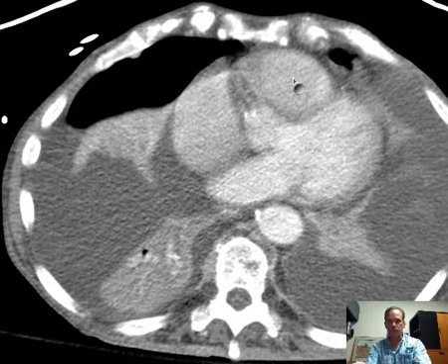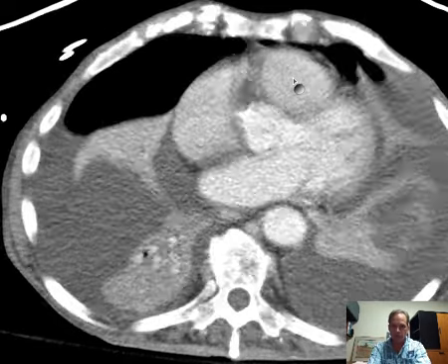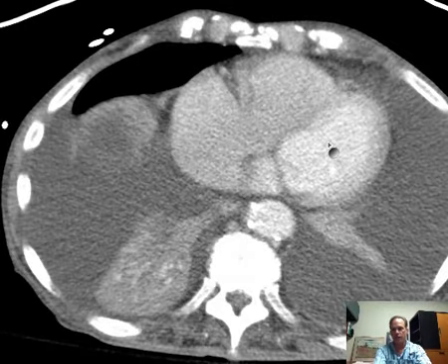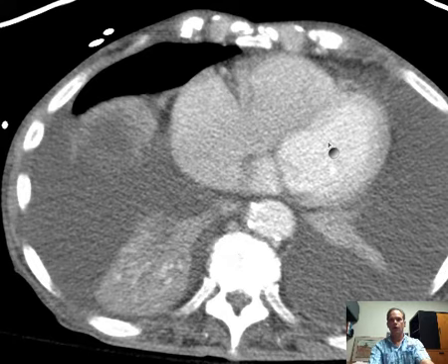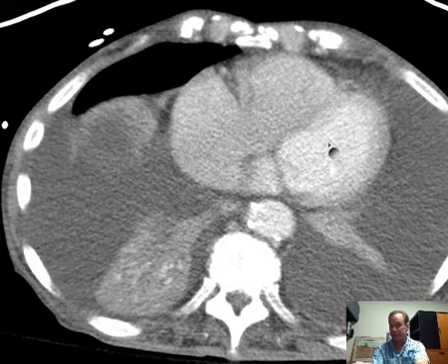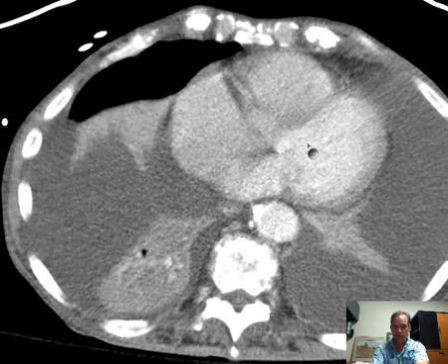But focusing on the ventricles for our present purposes, take a look and you'll see the right ventricle is going to give rise to what vessel? The aorta or the main pulmonary artery? Well, the left ventricle supplies the whole body. It better have oxygenated blood because it's going out to your brain and kidneys and such. So let's see where that goes.